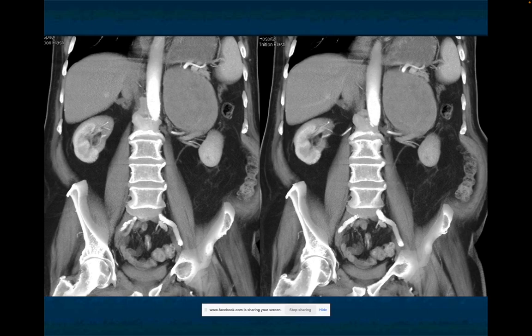But another thing you can consider, and something you should consider, would be lymphoma. Lymphoma can involve the adrenal only, although most times adrenal is multi-organ involvement, but it can involve the adrenal only. It can maintain the adrenal shape, but not always, and it can be large and it's relatively hypovascular, as is the case here.